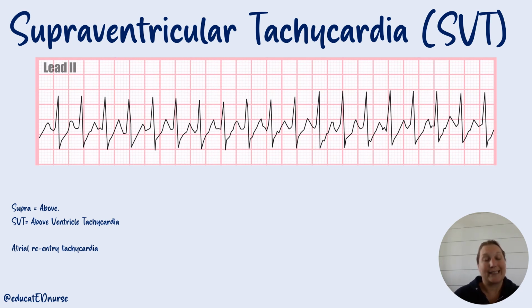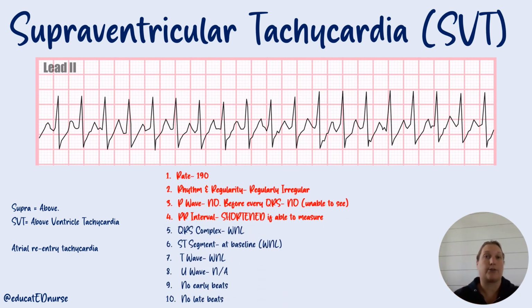And actually, it's considered an atrial reentry. So there's a problem with the electricity or the reentry, which causes that tachycardia. So you'll probably see some people consider it ventricular. I have never done that. I just consider it an atrial dysrhythmia. Anyways, SVT.